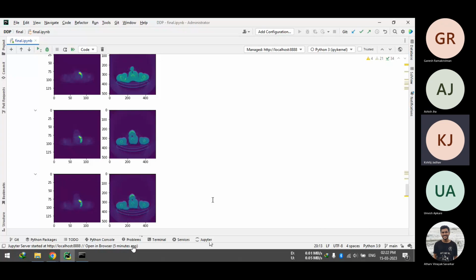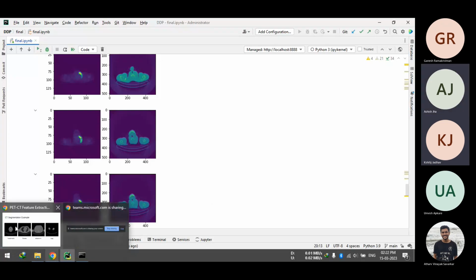So what we basically want to do, Ashish, is identify in which organ the tumor is, and why we decided to do these segmentations. First, this is how these CT scans were provided to us, in 4 segments, so we thought probably there is some logic to it. Second, we are going a bit retrospectively: we first identify which PET scan images have the maximum SUV, and then we use that PET scan ID to identify which organ it is.